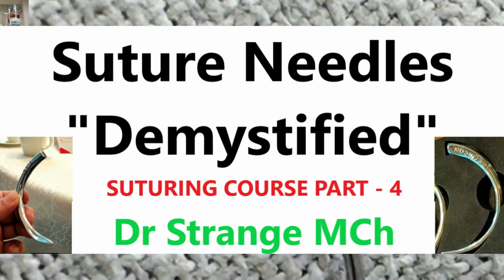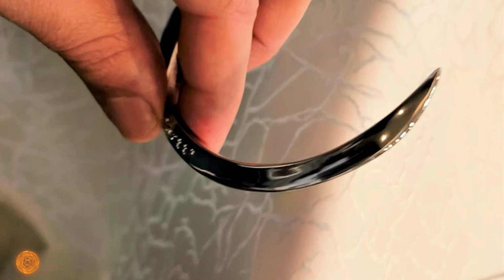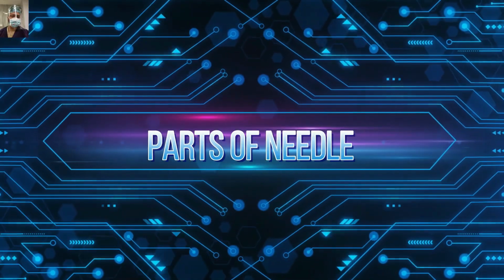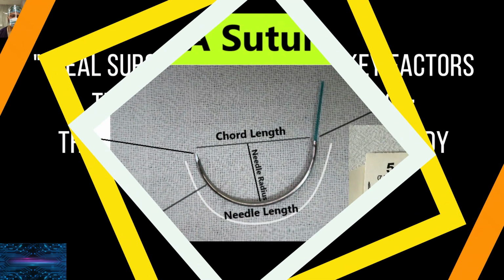In this part 4, we are delving into the critical aspect of suturing, that is, the different types of suture needles. So, let's start first with parts of needle. Ideally, there are three factors which decide the quality of a needle: the alloy, which is the material it is made of, the geometry of the tip and the body, and its coating.